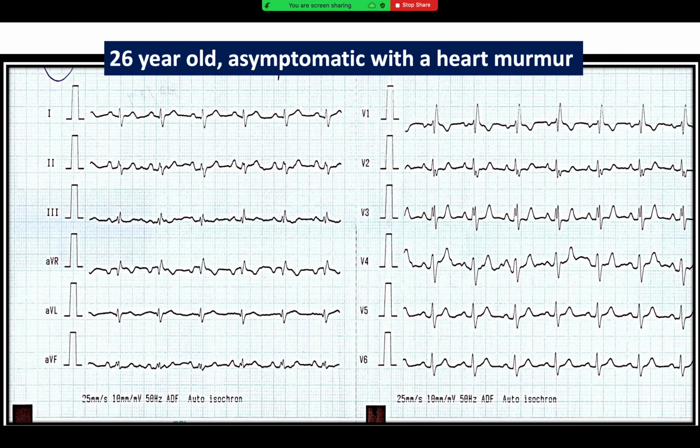So we notice it is a sinus rhythm ECG, and heart rate is slightly in 90s. Yeah, agreed. How about the axis? It is right axis deviation. Then looking at the P wave, it is tall P waves. Yeah, so this is right atrial enlargement. Good. How about the V1, V2 if we notice? Right ventricular hypertrophy, right? Similarly, if we look in the V1, R' pattern.